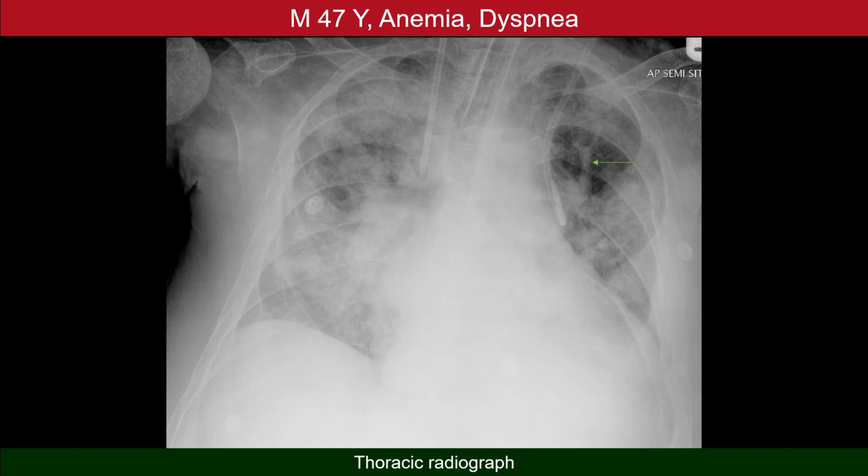Observation 4. The left upper lobe has been the only site of the lungs where we can identify a sharply defined pulmonary vein delineated by aerated lung. Observations 5, 6, and 7, a right central venous line, an endotracheal tube, and a nasogastric tube, all of them are properly placed.